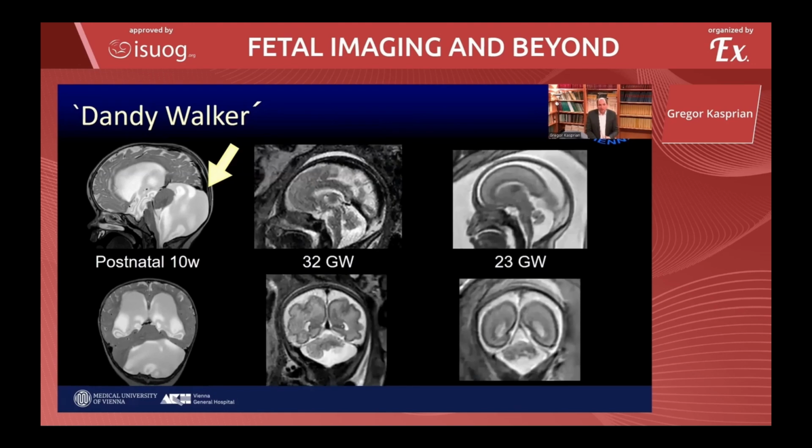This is absolutely not true in that case, because if you look at the prenatal images of this case, you see that at 23 weeks, we could see some hemorrhage of the cerebellum here involving one hemisphere, even sparing most of the vermis at 32 gestational weeks. And by closure of the aqueduct, and closure of the outlets of the fourth ventricle, the cyst of the fourth ventricle was developing secondarily after 32 weeks and was mimicking the image of a Dandy-Walker malformation.